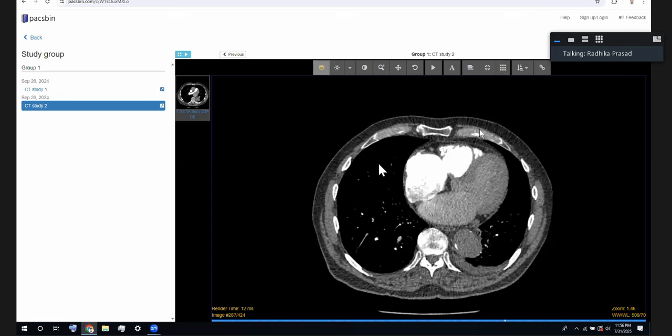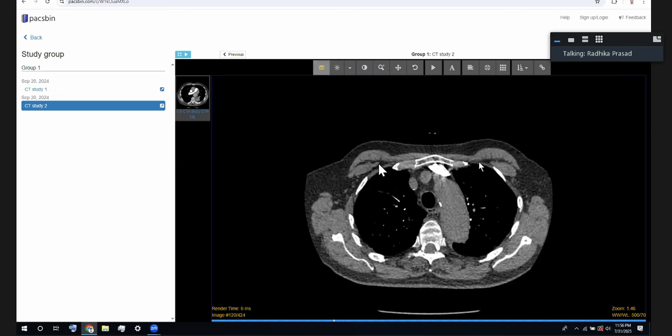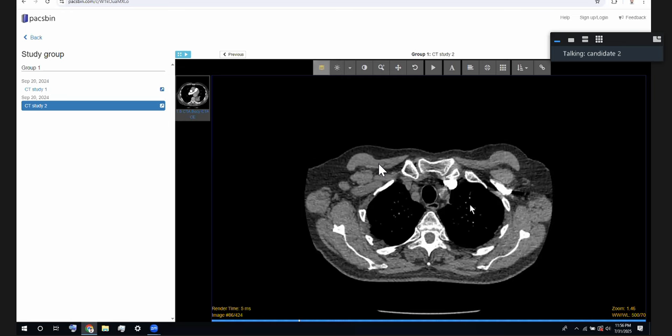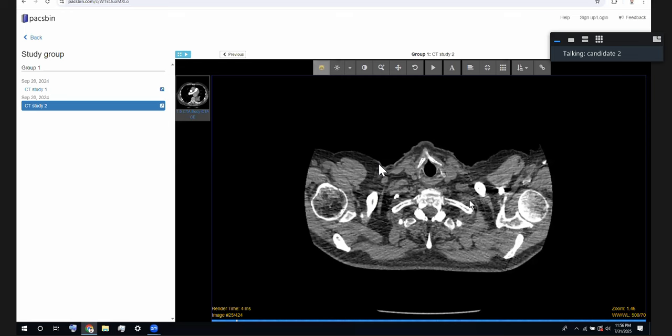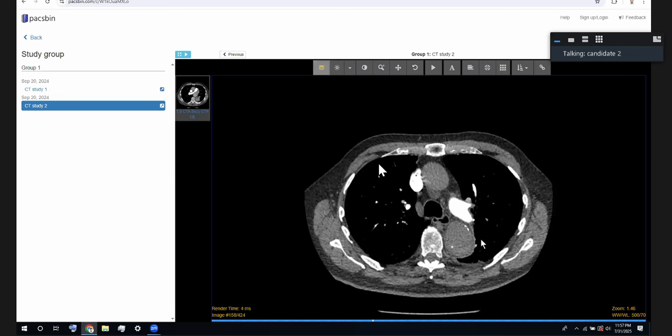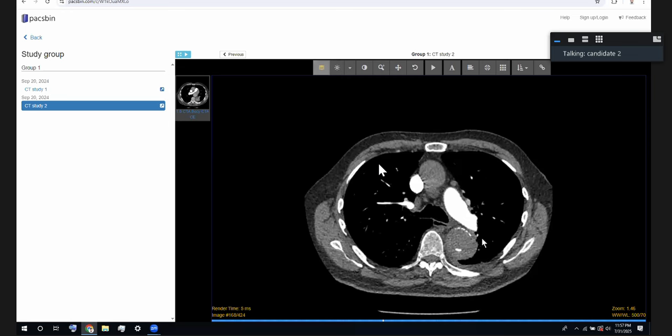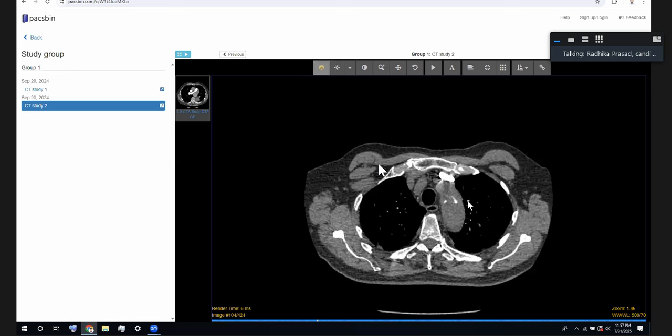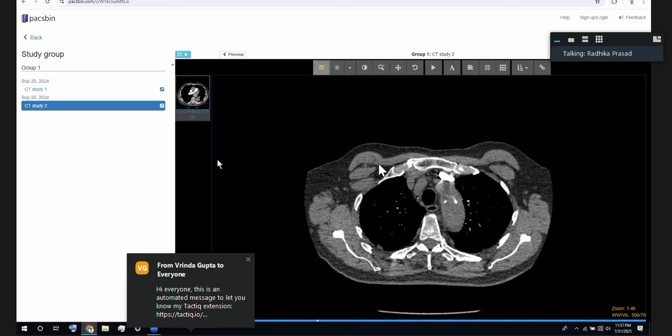So I think you've got enough information there to tell me what you want to do next. I'm thinking of acute aortic syndrome, probably intramural hematoma, and dissection I want to rule out. So aortogram for further evaluation. Okay, so there you go. That's the first case, isn't it?